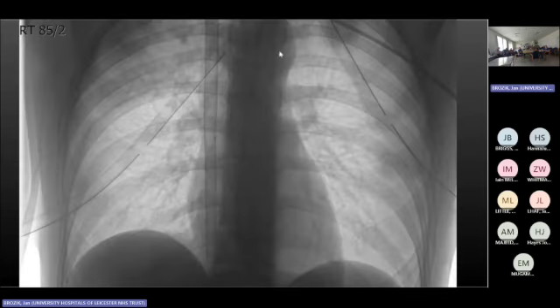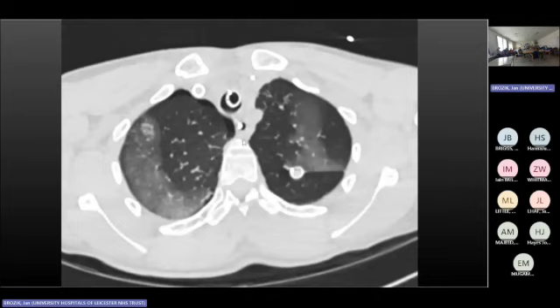You still see bilateral abnormalities. We did a CT, but there were no clever findings. So there was still that pneumothorax drain that traveled into the fissure, but that's fine. Lung really expanded, and still quite weird ground glass opacities. It's strange, and it's bilateral pneumothorax, bilateral chest drains. What happened? Who can tell me? Probably didn't see my presentation chest X-ray, so I showed this as well.